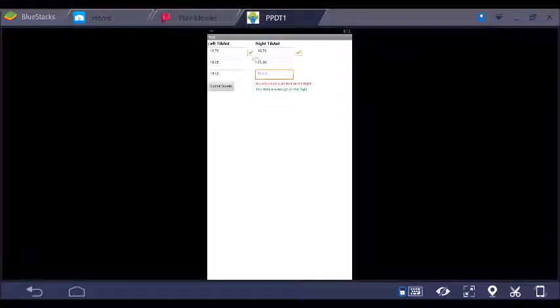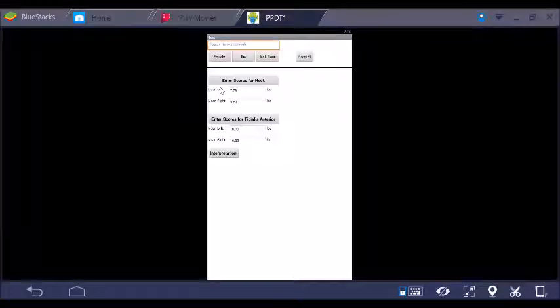So what these little check marks here next to the first test fields are basically saying is, do you want to include this first test within the calculation of the mean, or do you want to get rid of it? In this case, I'm going to get rid of it, because I think if I don't, it's going to artificially pull the mean down. I really don't think that this 12.76 is actually true compared to the next 2, which were almost identical to each other. So I'm going to uncheck that, call that a calibration test to get rid of it, and I'm going to submit those scores.